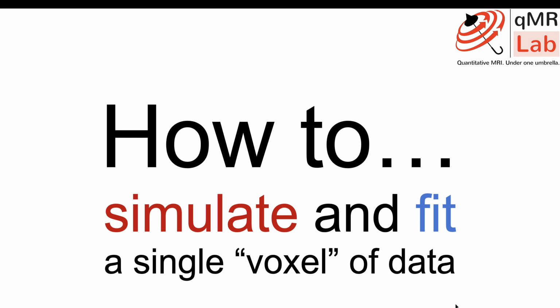And so I find simulations are very useful to get some of this intuition, and it's a good way to explore how some potential sources of errors might affect your data. And specifically if you're designing your pulse sequence or protocol, this is a good way to test out your protocol before you go to the scanner.